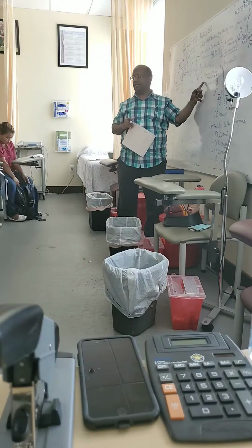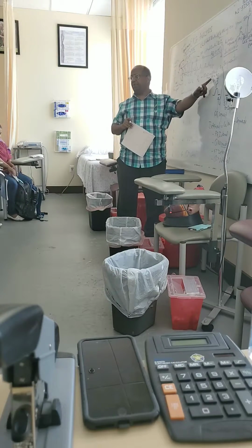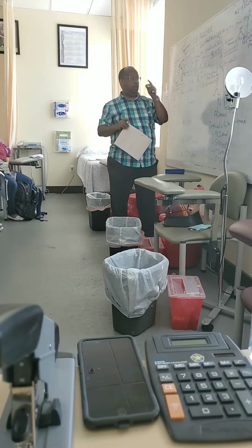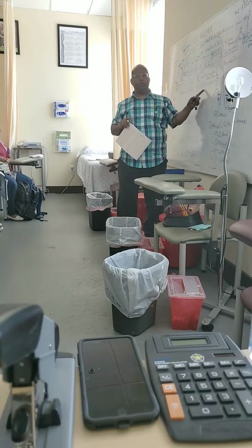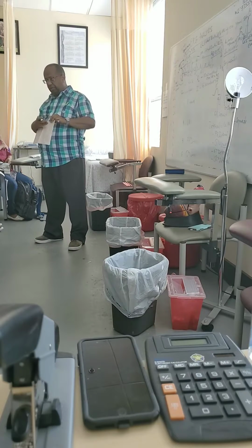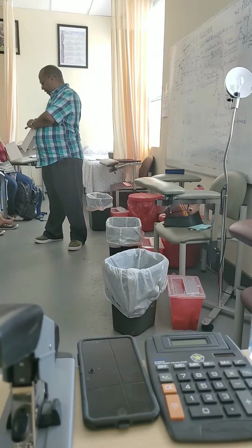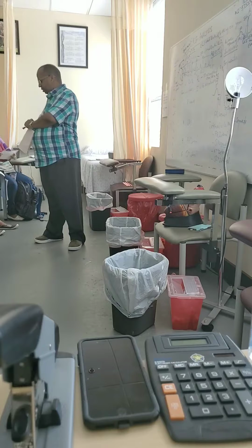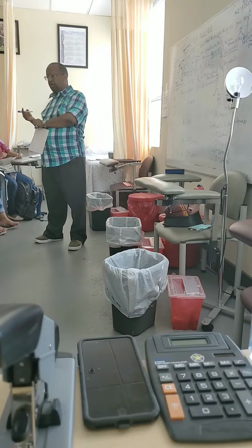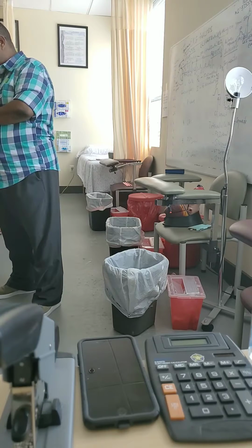You do that if it is regular. 1500 divided by 15, or 30, or 20, depending on your count. When it's irregular, you do the 6-second method. What does it mean? You take a 6-second strip. How do you take it? Can you see the little marks on our strip, inside of the boxes? These lines are 1 second each. From here to here is 1 second.